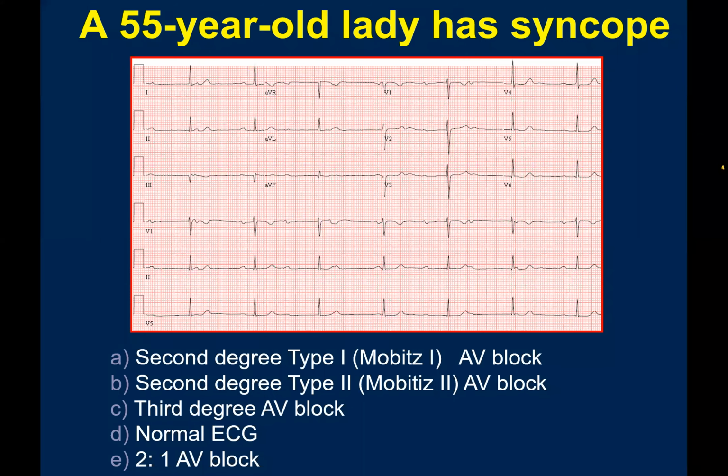Moving now from ischemic ECG changes, this is a 55-year-old lady who has syncope, and this is the 12-lead ECG. We have different possible causes. So again, any volunteer to take this ECG? Okay, I'll start. Please.